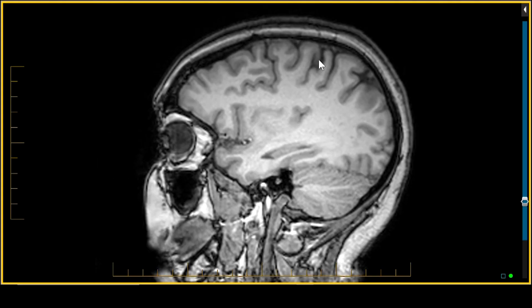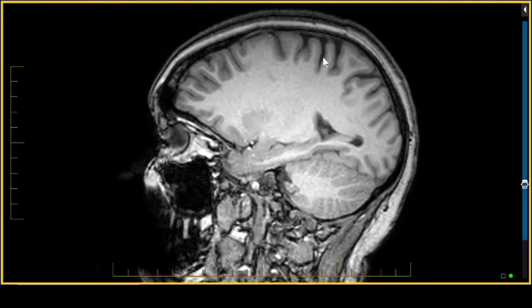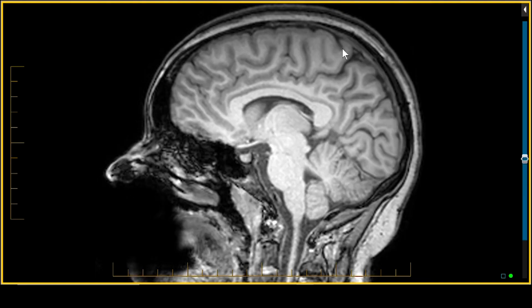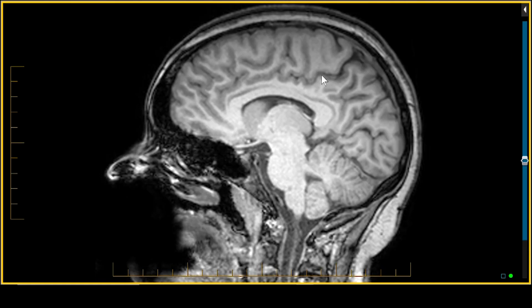Here it is. Here's the central sulcus, and work our way towards the midline. You're going to see how hard it is to follow it continuously all the way back. We're still following it, and we've got it. It's this little oblique slit that is found just anterior to this structure right here, which is composed of the cingulate sulcus and the supramarginal or marginal sulcus right here. So once you find this long, stringy sulcus that goes into the cingulum, right in front of that, the oblique, dark area seen anterior to it is the central sulcus of Rolando in the midline.